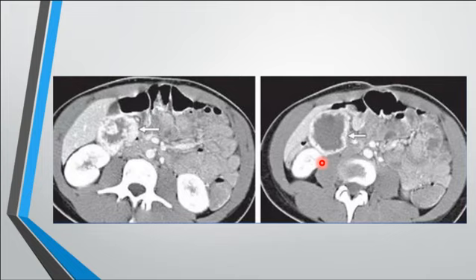GIST. Okay? Irregular thick inner wall, thick mucosa. No. This is a lesion. Space occupying lesion. This is a mass. All of it is mass with big central necrosis and thick peripheral post-contrast enhancement. You can see intense post-contrast enhancement here and here around the necrotic center, just as a vascular tumor. It's a bloody tumor. And in the central part, there is enhancing soft tissue. Yeah, sure. It's necrotic areas with some preserved areas according to the size of the lesion.